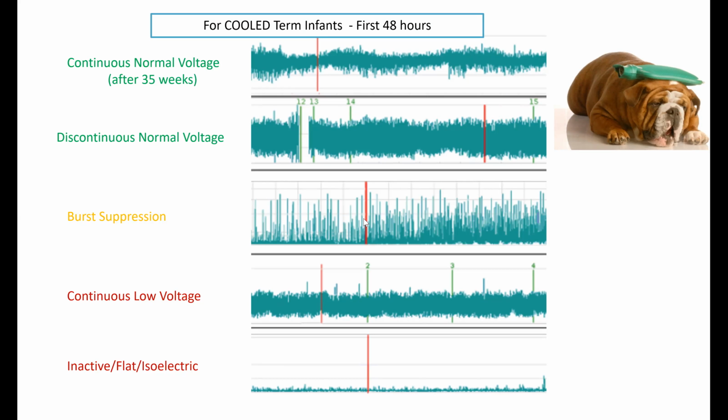Depending on the age and the other things going on, I don't often see a flat. I've seen it only a few times. And one time was after a dose of Ativan. And it started recovering within about 12 hours, some recovery. But I think it's a trend, and it's a limited channel. There can be activity in the brainstem, there can be activity in the frontal areas. We're not monitoring those areas. So I always say, this is what I can say based on what I'm monitoring, but certainly there can be other activity in other places.